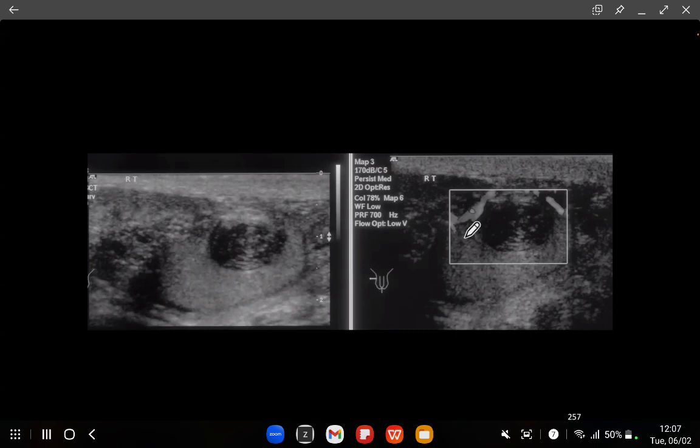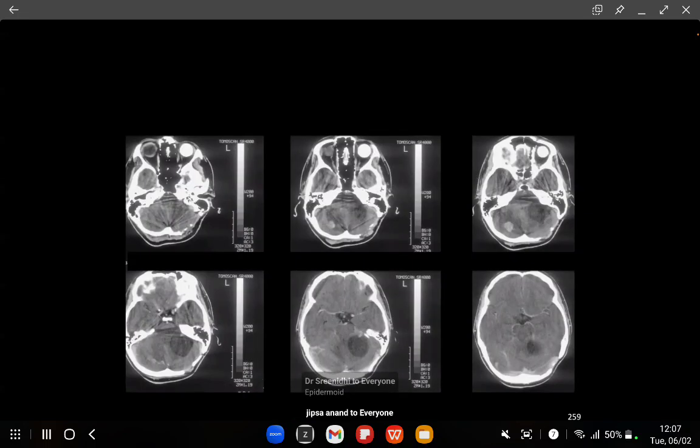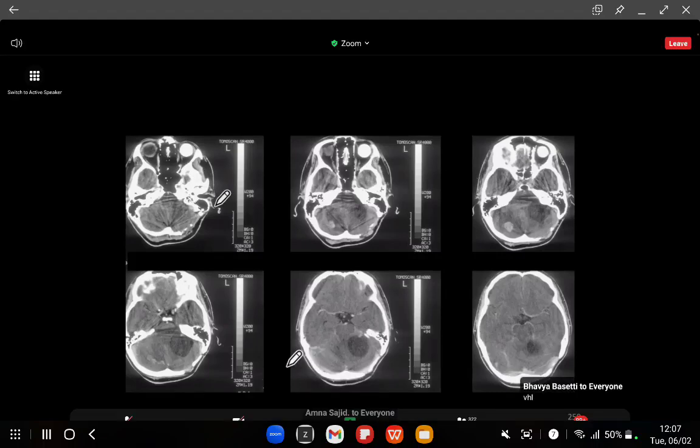Okay, onion skin, testis, epidermoid. Yep, brilliant. Okay, what have we got here? Yeah, von Hippel-Lindau syndrome. Why has the patient got a prosthetic eye?